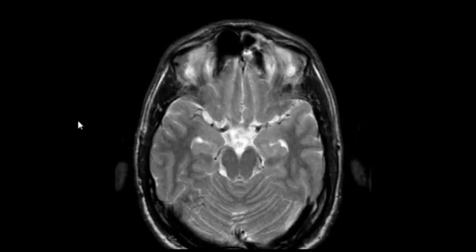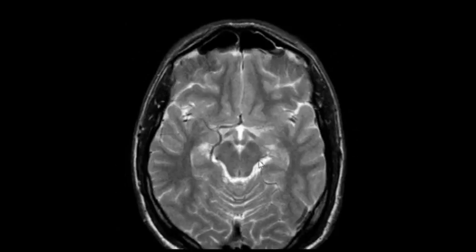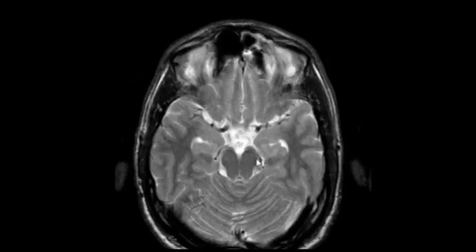Because I can see settle... temporal lobe. Where is the temporal lobe? This one. Okay. Edema. Increased signal intensity, T2, yes. I think it's probably bilateral. Doctor, it's bilateral. Yes.